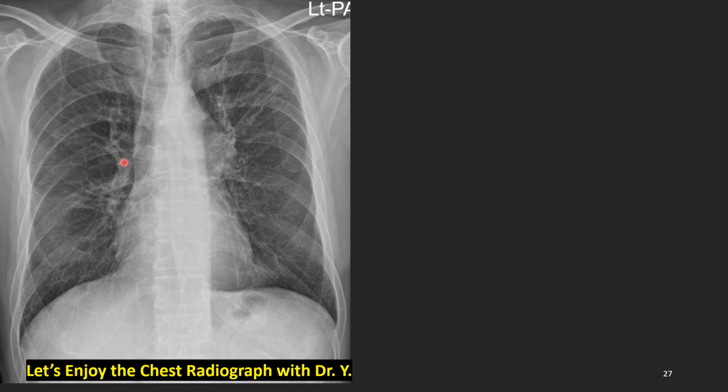Nothing abnormal in the right side hilum? No, clearly it is abnormal because normal pulmonary vessels are not visualized, and there is increased density, increased size, irregular border, and streaky density all around. Yes, this is the famous hilar tumor, hilar cancer of missed lung cancer. This is the highlight image of missed lung cancer. Please pay more attention.